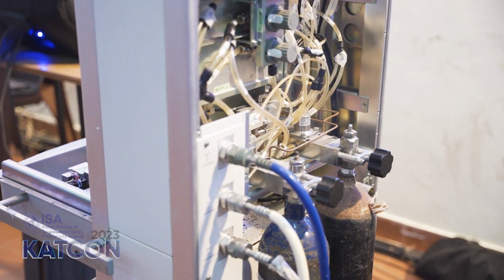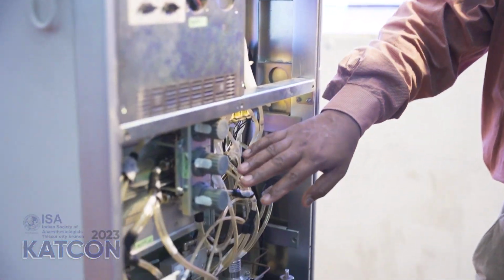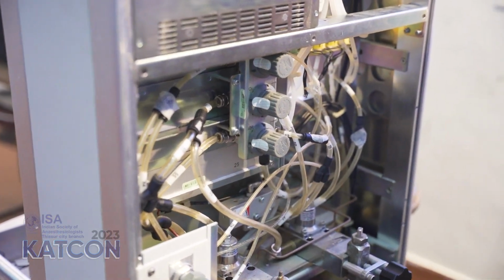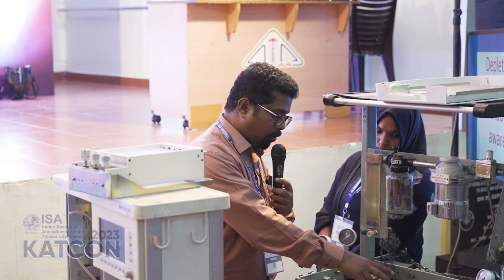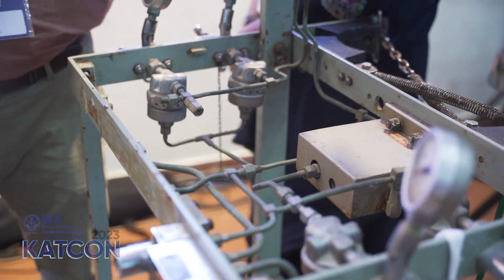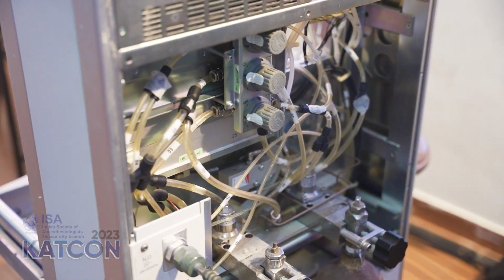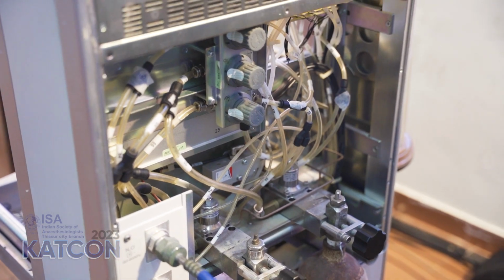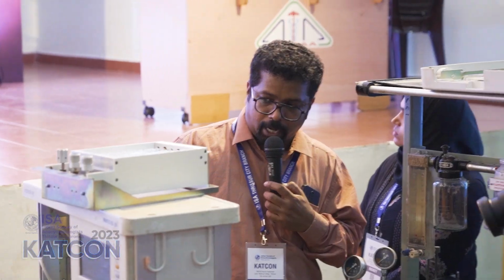Okay, due to the lack of time, I will rush through. We have already shown you where the second stage pressure reducer is. This is a big difference from the old machine because there is only one pressure regulator, and the intermediate pressure system goes directly into the flow meter. Here we have a second stage pressure reducer with pressure for nitrous oxide around 26 psi and oxygen around 14 psi. So from there it goes into the proportioning system or hypoxic guard devices.